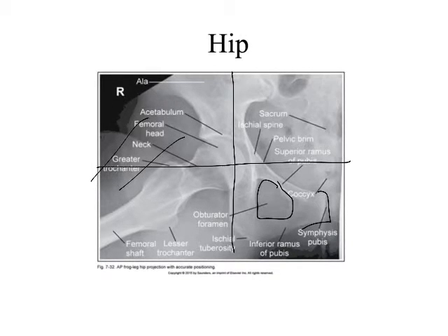Now, it looks like there's some quantum mottle here, right? It looks kind of jaggedy and funny up there to me. So if I was evaluating this image, I would have to be real careful because it looks like they have appropriately collimated. And then what's this? It's a digital marker, right? So if we were doing PACEMAN on this image, we have some question marks here that are starting to come up because we have what looks like quantum mottle down in here, and then we have a digital marker, right? We can see appropriate evidence of appropriate collimation here, but not necessarily evidence of good shielding, right?